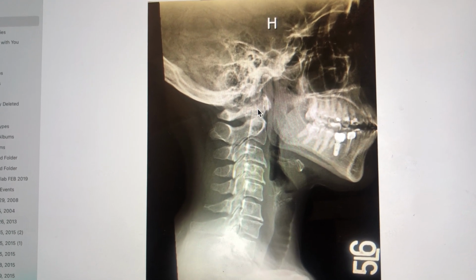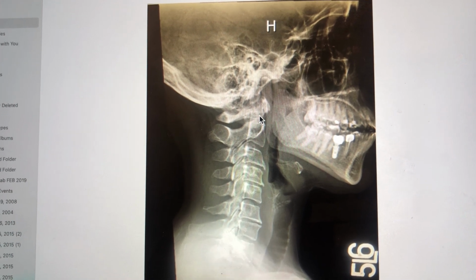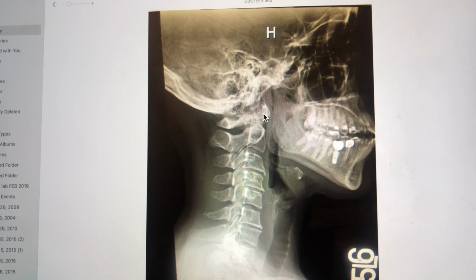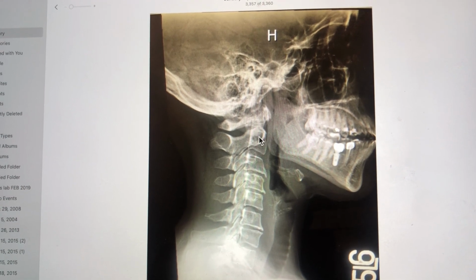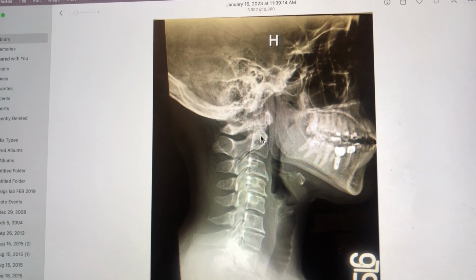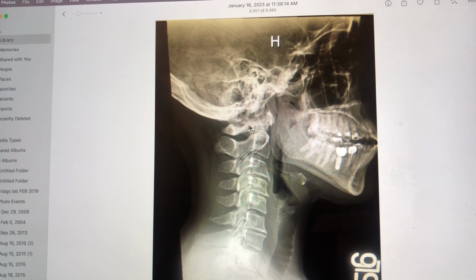If you look at this vertebra and this vertebra, this relationship is interesting too, because this vertebra you can't see from the side, but it looks like a donut ring. And this one sits on top of this second cervical vertebra, and the second cervical vertebra has a projection that goes up like this and provides an axis of rotation for this vertebra.